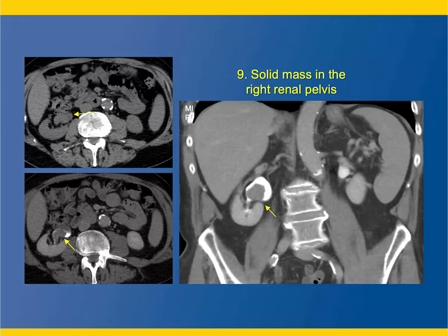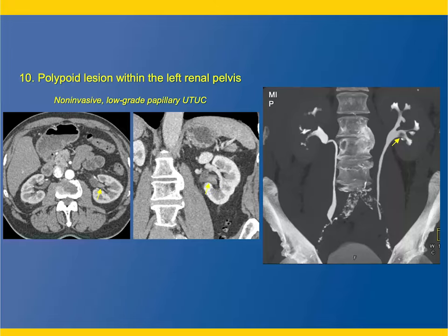Another example, non-contrast mass in the renal pelvis. And then, of course, as you give contrast on the excretory phase imaging, the lesion is very well defined. The mass is about 2.5 centimeters, but this patient will need a nephrectomy because it's a large mass. There's no partial nephrectomy going to happen in this case. And again, you want to look very, very carefully.